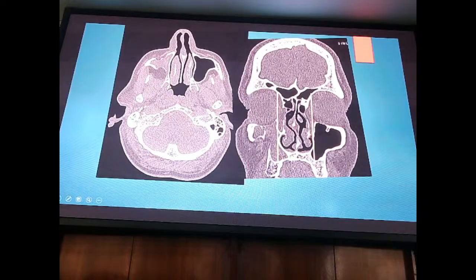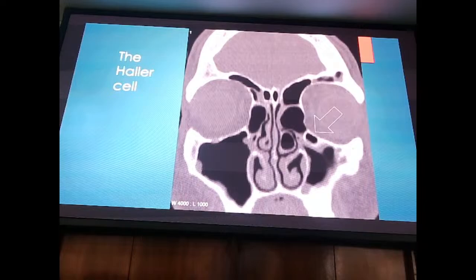If you draw a line, because of the implosion, there is a curve in the medial wall of the maxillary sinus, which is making it push more laterally. So the entire sinus, horizontally and vertically, has become small. That is why it's called imploding antrum syndrome. So we all know the pathology. It's basically an infundibular atelectasis where there is a block which causes imploding antrum syndrome. So those are the 6 signs that you need to know.